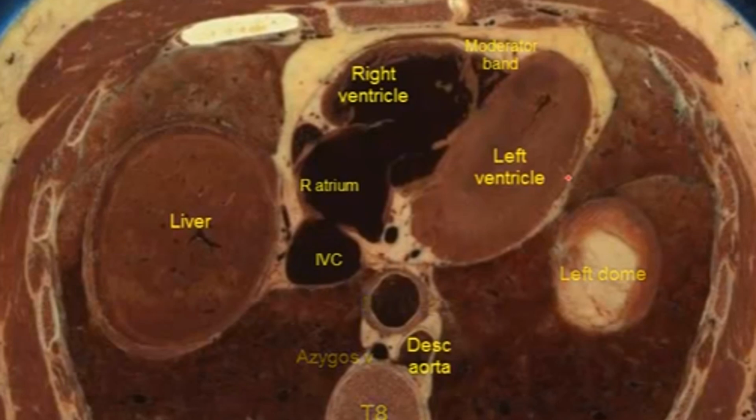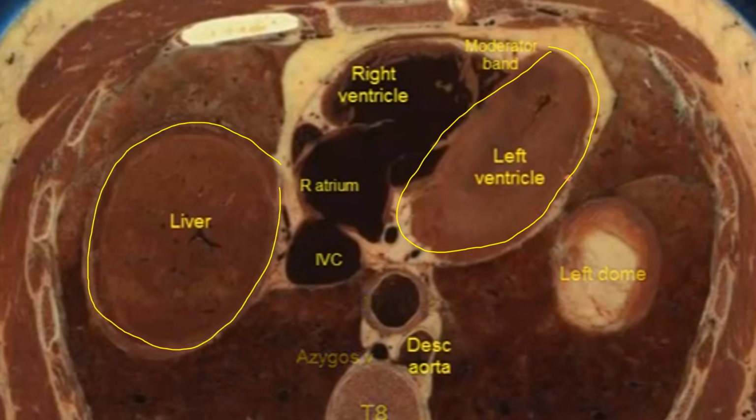So when we're looking down, we're getting further down, and that's all that middle picture was just showing you, roughly where we were at. We're still seeing the bottom part of the left ventricle, so now we don't see any of the chamber anymore. We're just seeing all the meat, all the muscle, the myocardium there. Now we're starting to see more of the liver appear and less lung tissue, and now we're starting to see the bottom of that dome, the apex of the diaphragm on the left side start to appear. Here you still see the descending aorta.